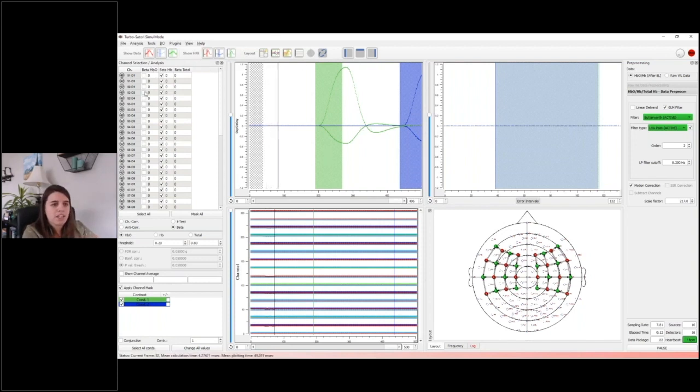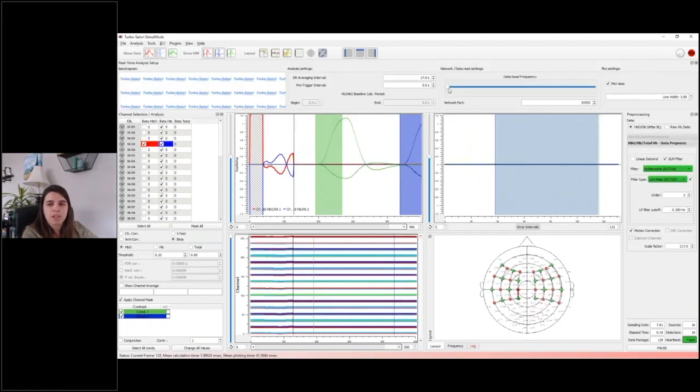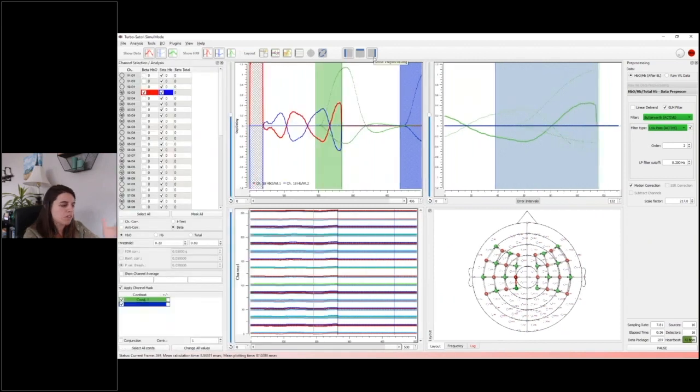So if we go ahead and select a data channel, we can start to see that data pour in. We can change the rate at which the data is read by using this data read frequency meter. Since this is previously recorded data, I don't have to read it in at the same rate that it was actually recorded. I can speed it up. I just used these little navigation bars. These are handy if you want to focus in on a certain screen. You also have the option of easily switching between these panels using these buttons up here.